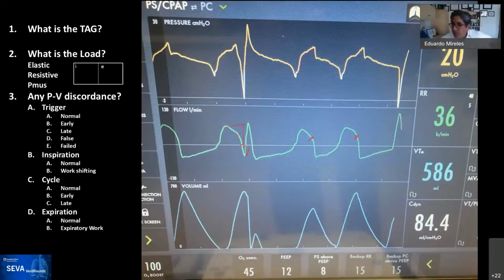So, yeah, I think that's a patient. No doubt, Miguel, that's a patient-initiated breath. So that's why we think that it may be a cough or a hiccup after that breath afterwards. So, very good. Can I ask you a trick question?